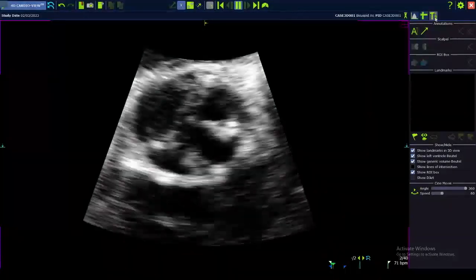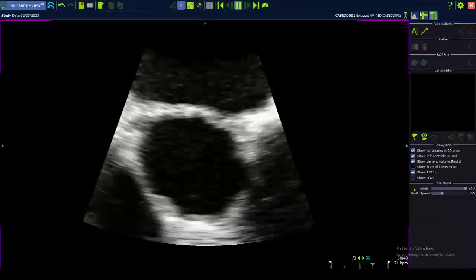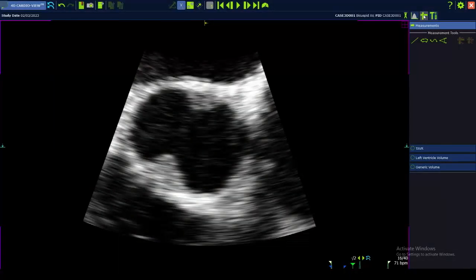Okay, so up here on the right-hand corner, we have these 3 tabs. I'm going to go to this middle tab now. These rulers mean measure, right? That makes sense. So I'm going to click on the measurements tab. And I now have some options for diameter measurements. I have options for an area measurement and some other measurements. So I want to go with this area one.